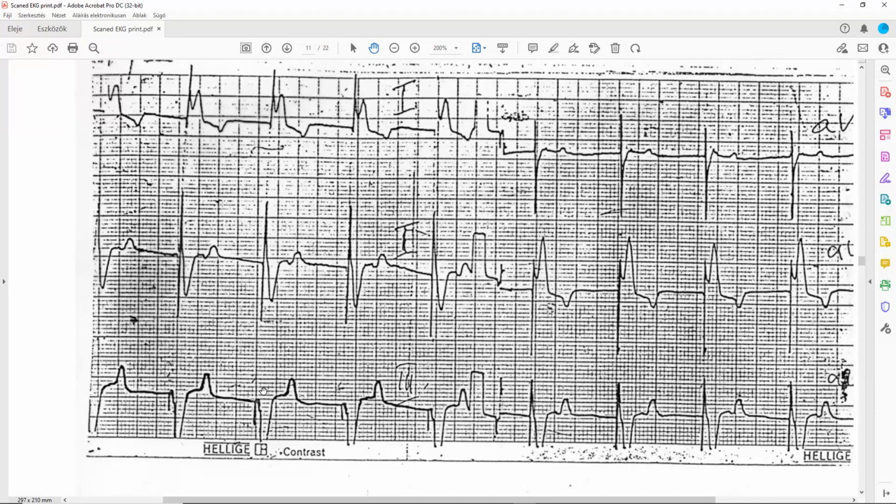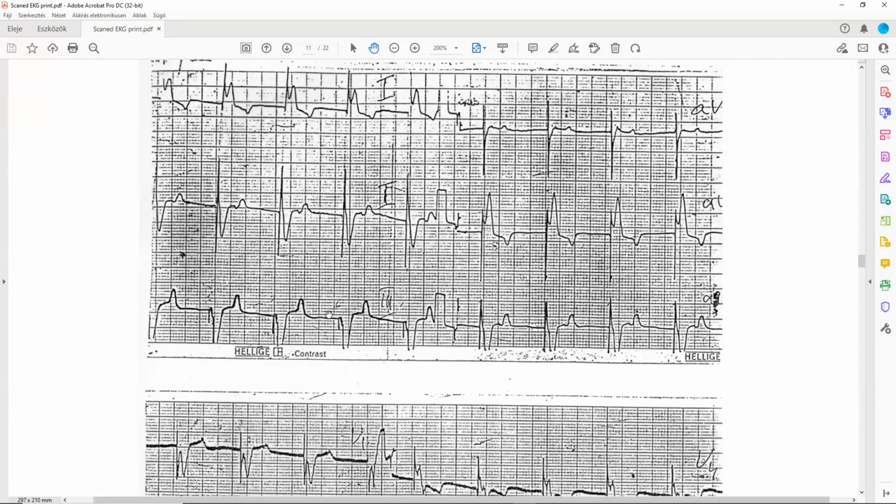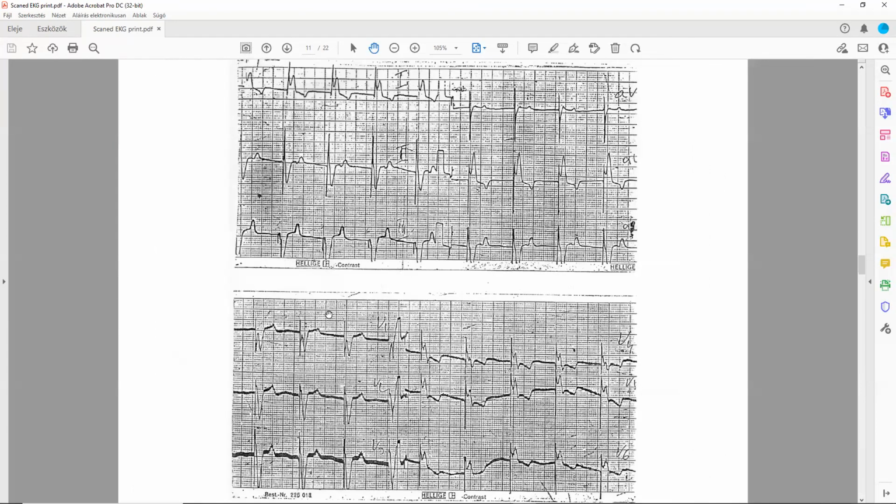Okay, now, which ventricle did they put the pacemaker in? So where is this artificial pacemaker? Now, what do you think? I think maybe in the right ventricle. But you have to explain why. It's not enough to say maybe. I think I just read it. Okay, think a little bit.